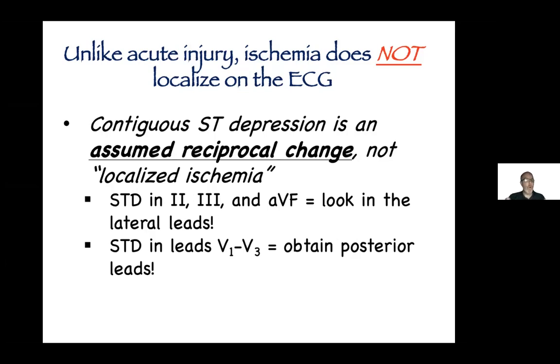So that means, and we've all run these EKGs before, where the computer diagnosis, which I will tell you gets fooled all the time. We should not be using a computer-exclusive diagnosis. We can use it to aid our interpretation, but we need to use our own mad skills to finesse and navigate that EKG on our own. Oftentimes that machine will say something like non-specific ST-T wave abnormality, consider inferior ischemia. That is a misnomer. Your 12 lead cannot localize ischemia in a particular lead configuration, which means that when your heart is ischemic, you're going to see ST depression everywhere.